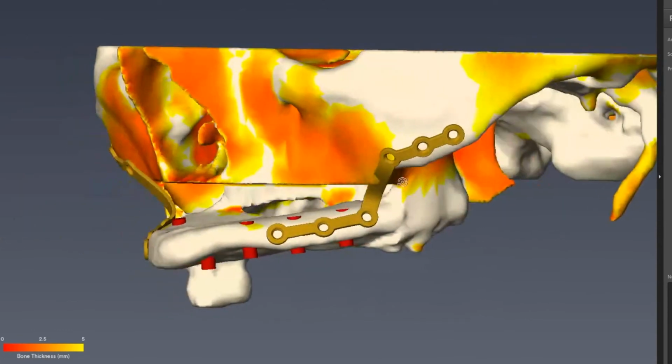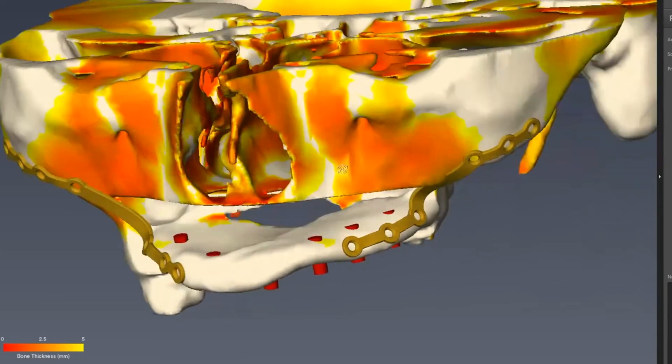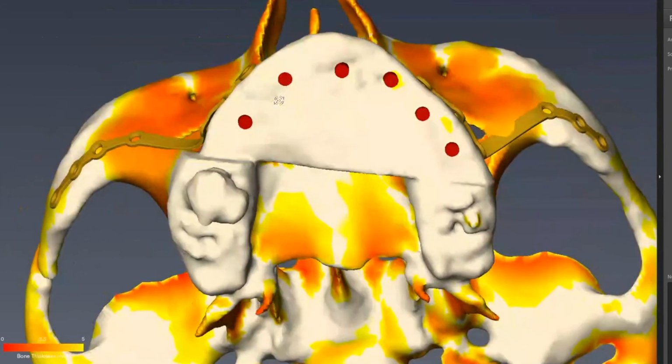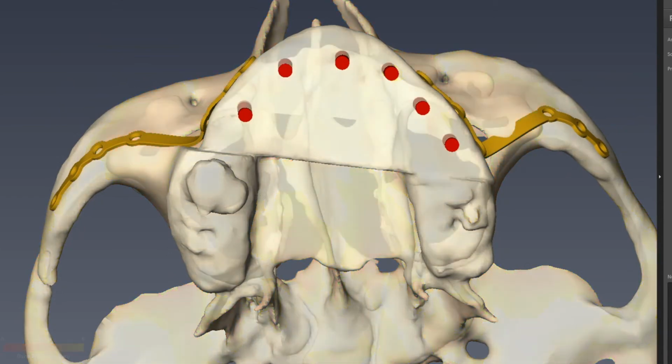Okay, great. Do you want anterior support at all on it, or are you happy without any anterior support? I think the only thing I would do, not having something in the midline, is perhaps a 2-hole plate on the palate. If you tilt the flap up, let's look from the palate side, and perhaps we had a Y-shaped plate with 2 holes on the native palate and 1 hole, just to avoid rotation, so it'll be 3 points.